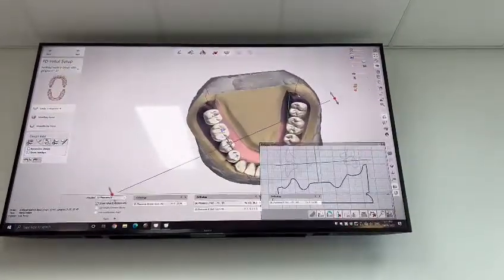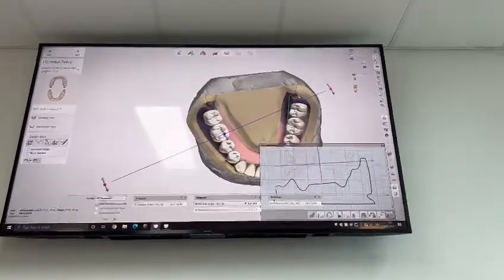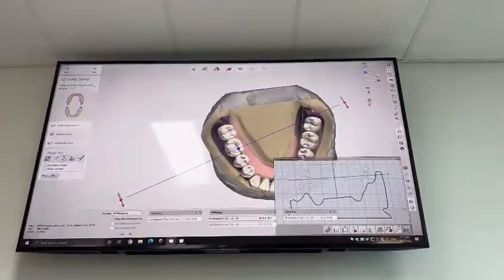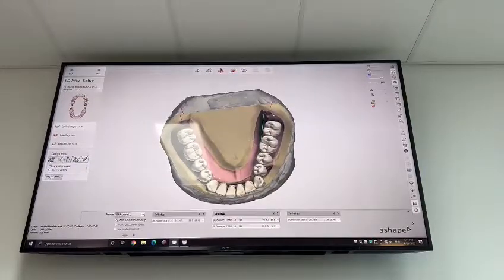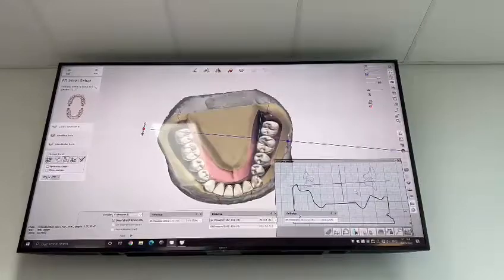Bring this back here, good. When I'm setting them for real patient cases, this is what I do, guys. I've probably set 300 or 400 cases like this now, so I've got my technique down pretty good.